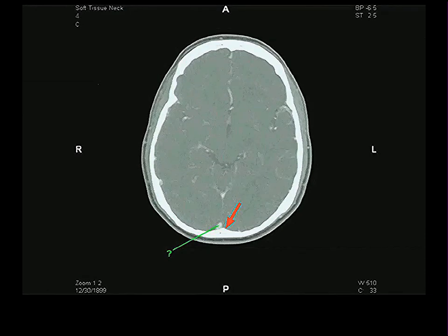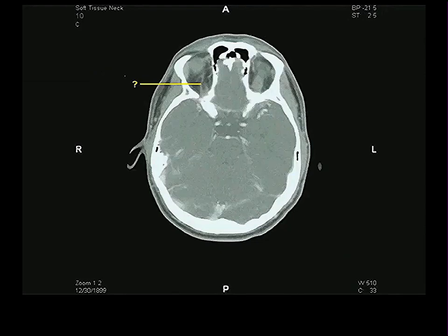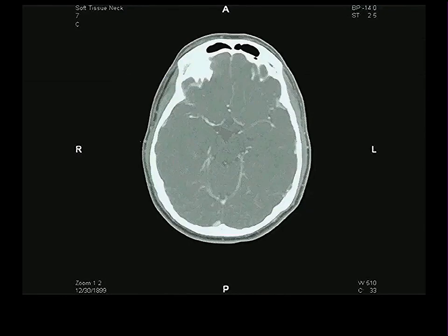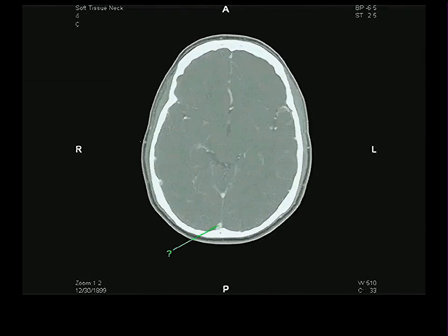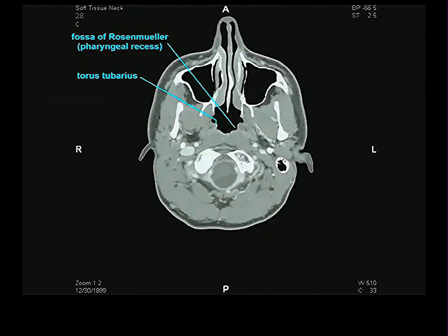So here's the internal occipital protuberance. I haven't been following this, but we must know what that is. I won't even ask you. That's superior sagittal sinus. This is either inferior sagittal or more likely the beginning of the straight sinus. These two things should connect with one another at some point. Maybe they did down here, lower in the section. So here's the junction of straight and superior sagittal, and then as we get higher and higher, it'll turn into inferior sagittal, this one, and the great cerebral vein of Galen.